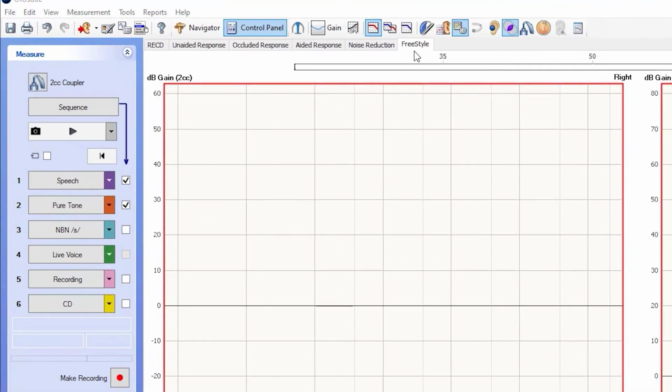In this example, moderate noise reduction associated with each stimulus. Freestyle is another option for advanced feature verification within the Aurical PMM module in OtoSuite. Access the Freestyle tab in the PMM module to verify advanced features such as directionality, frequency lowering, and feedback management. You can also use Freestyle for hearing aid transition to match a client's previous hearing aid settings, easing the transition with their new devices. You can verify wireless hearing aid options such as CROS, remote microphones, or FM systems when you access Freestyle in the Aurical PMM module.